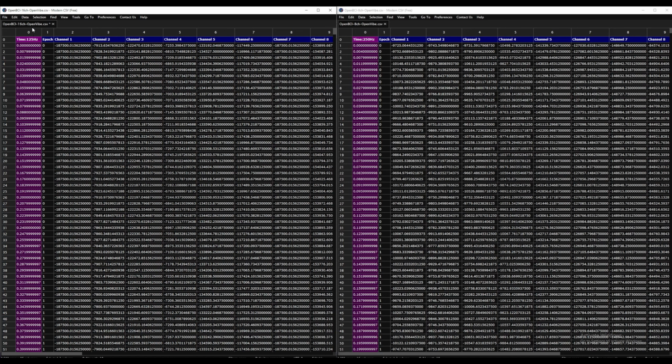So for the time column, this is the first important difference, of course, is the sampling rate. So all OpenVibe CSV recordings would start with capital T time, colon, the sampling rate, and capital H and small z for Hertz. And then you have the timestamps under it, which is standard for any sort of biomedical or any time discrete signal record for that matter.